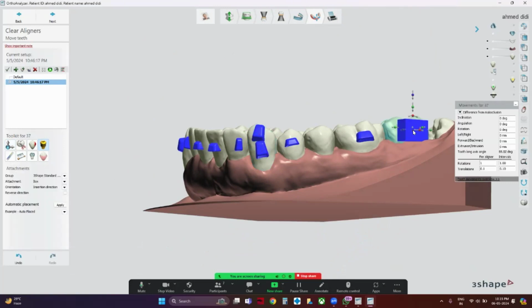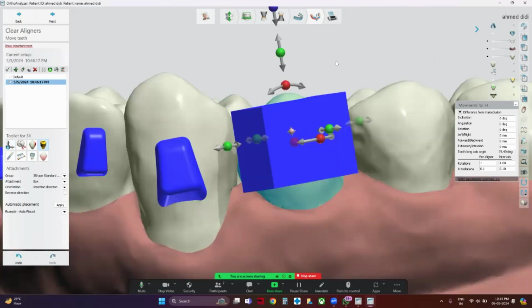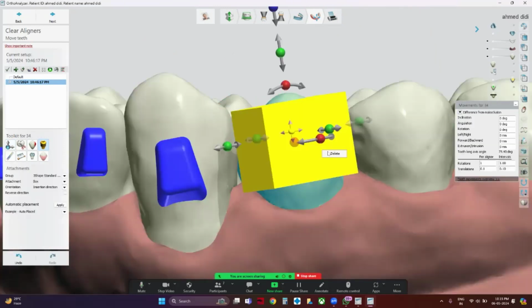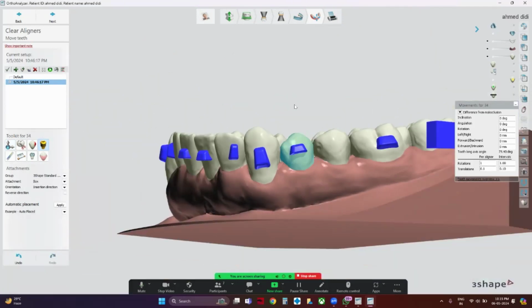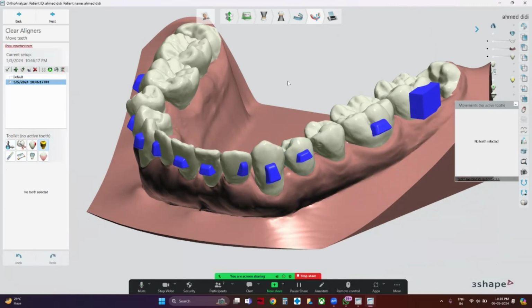If I go to this tool, add an attachment over here and come back to this, it will let me edit it, and it will let me delete it also. Can you see? But the same thing with Dr. Munira's added attachments does not happen. That is fixed now. That's incorporated into your plan and it's now a part of every sub-setup.